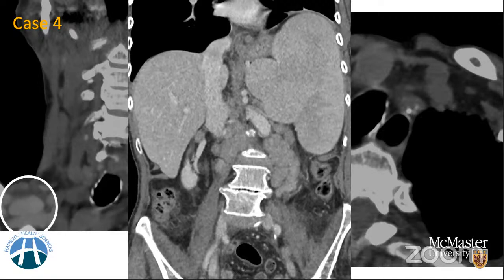In terms of solid organ involvement, it's somewhere, I think, up to 5 or 7%, if I'm not entirely wrong, but you can see solid organ involvement, and that is when you start to see all these mets in lungs, liver. They can go anywhere, even to the central nervous system. But remember, the first site or first checkpoint where the testicular tumors like to go is the para-aortic lymph nodes to the level of renal vessels. So I hope that explains that particular point.